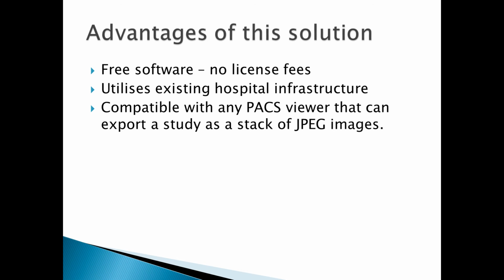There are some advantages to this solution. It's free software with no license fees or ads. It utilizes existing hospital infrastructure, and it's compatible with any PACS viewer that can export a study as a stack of JPEG images. Deployment also scales easily. The free license allows for distribution of the editing software to any students or doctors who might be interested in using it, even across multiple institutions or in other countries.